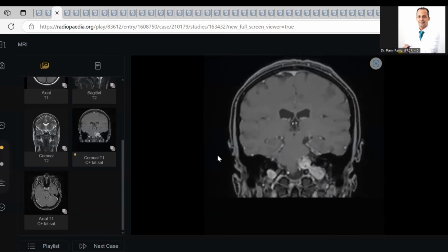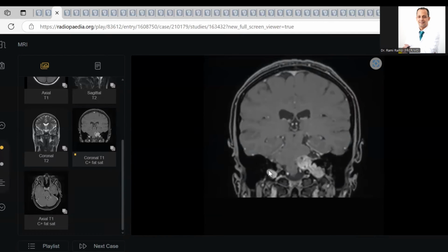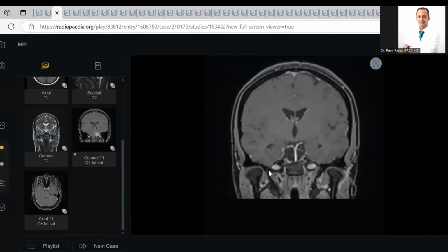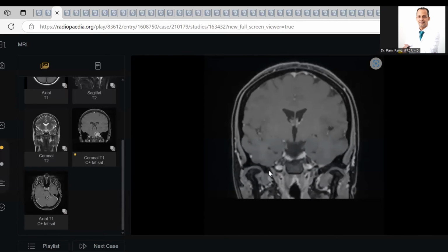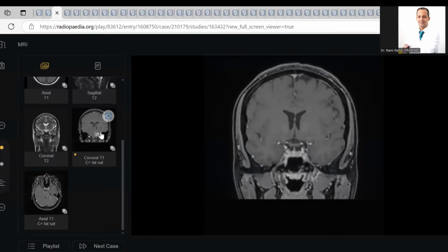So your differential diagnosis, see, this is the dumbbell. Your differential diagnosis must be within the jugular pathology. You should be thinking about jugular schwannoma, paraganglioma, any of them. You did very well, but you described too much without telling me two important issues.